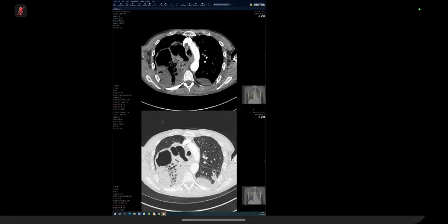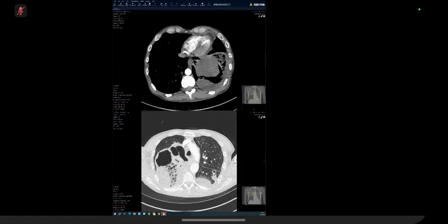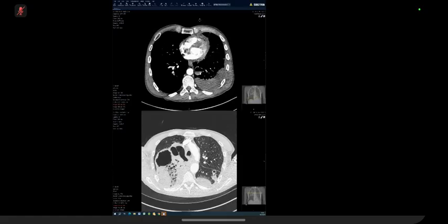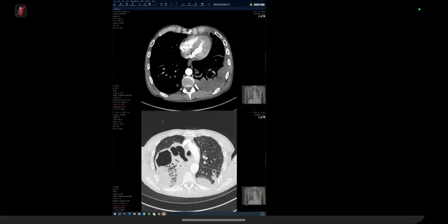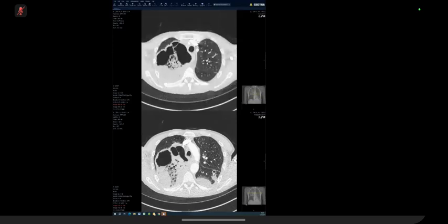I just want to detect if there is a split pleura sign or not. In my opinion, it doesn't pick up so much with the split pleura sign. So this is pleural effusion with multiple cavitary lesions in the lung. The initial diagnosis may be multifocal pneumonia, multiple lung abscesses, multiple septic emboli with flaring of inflammation in the lung.